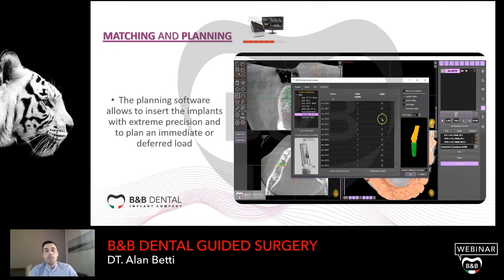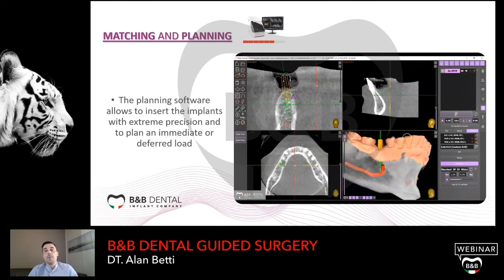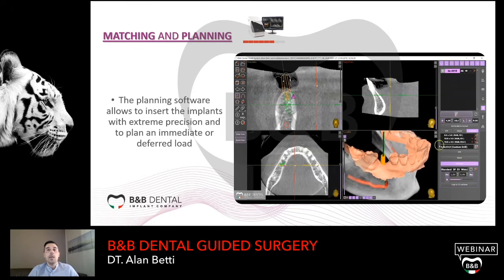For the abutment, 15 and 25 degrees. For the multi-unit, straight, 17 degrees and 30 degrees. And the flat, both for 3P, EVU and wide, and for slim connection.